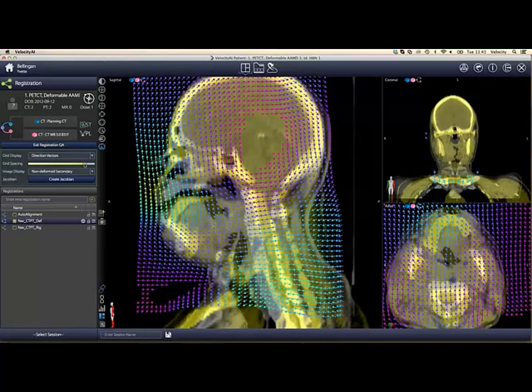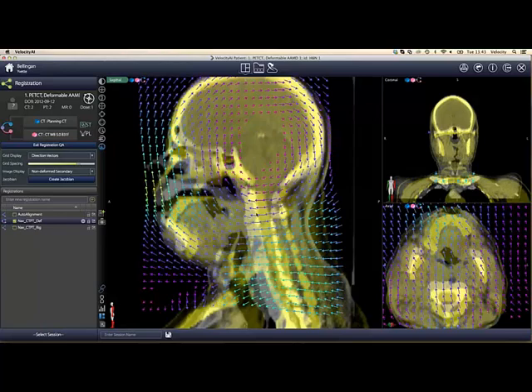We can also look at the displacement grid. Remember when we spoke about the B-spline defined on a grid of nodes, the optimization then finds the optimal nodal displacement. Now this grid is that lattice display that we've got. So if I put up my region of interest, you can see the red bounding box on the side. Inside that bounding box is where all my deformation took place.